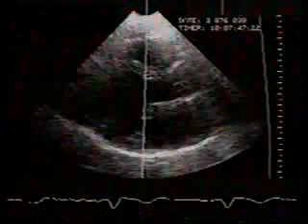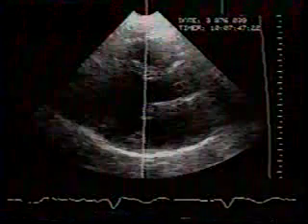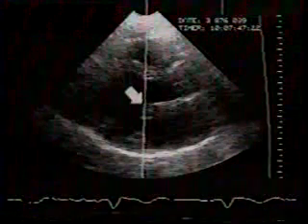This is a parasternal long-axis view from another patient with mitral prolapse. The M-mode cursor crosses the mitral leaflets. This is the M-mode that has been generated. Right ventricle, septum, anterior and posterior mitral leaflets, and left atrial posterior wall near its junction with the left ventricle. The leaflets are moderately thickened or redundant. In systole, rather than moving forward until the next diastole, we see this posterior motion beginning in mid-systole. This is prolapse.